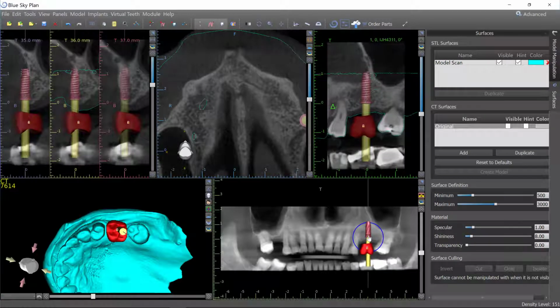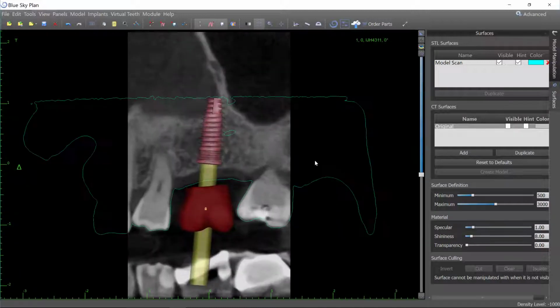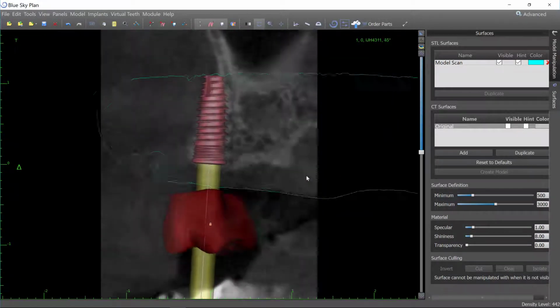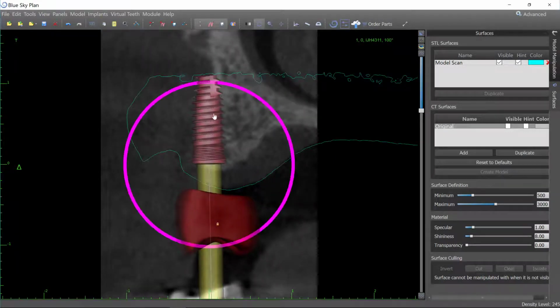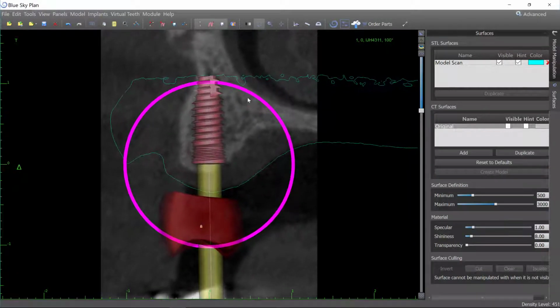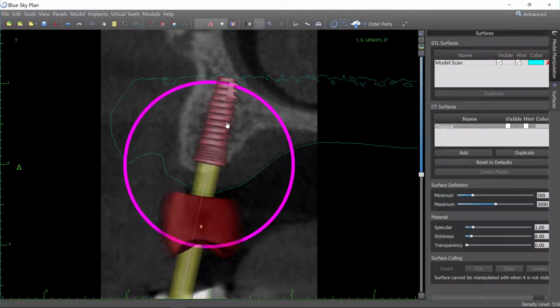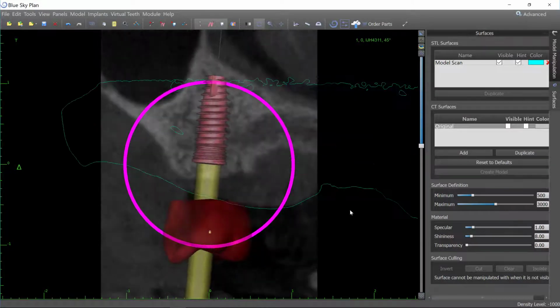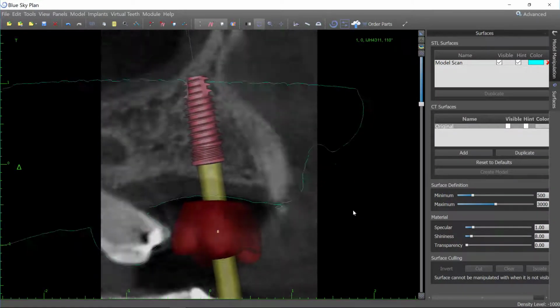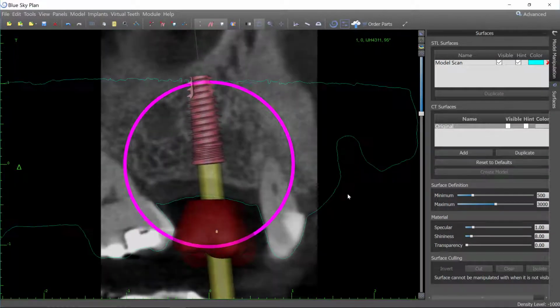So rough positioning is done in the pan window, and then I usually will switch to the tangential window, which you see here. Okay, so look at it from all your different dimensions. This is looking at it from like at the mesial, and we can pull that in, get this all within bone, spin on around, and you can see we're utilizing every bit of this bone up next to the sinus.